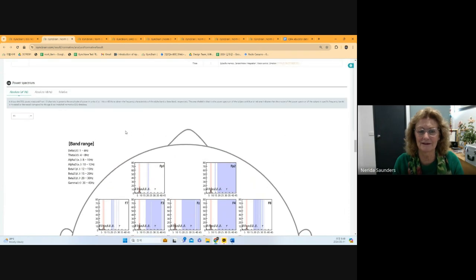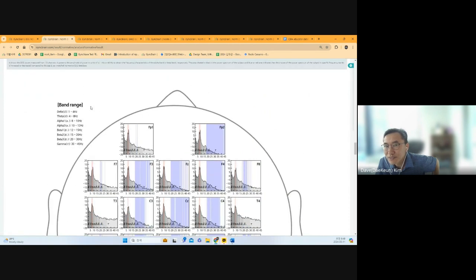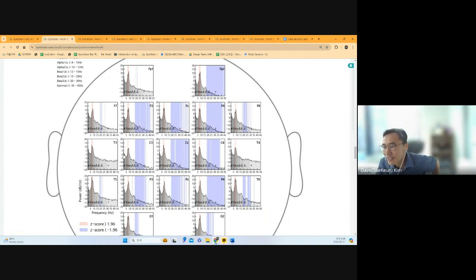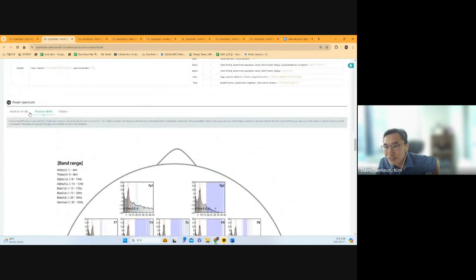For example, this is the dB scale. You can also see the detailed change of the high frequency activity. We offer the dB scale. So how do I change that? Because I haven't done that. Really? You can choose these two.